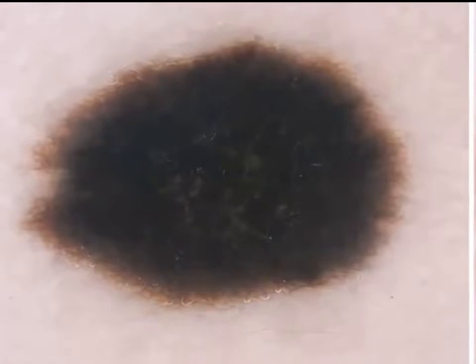Here, for example, we see structureless in combination with other patterns. Here we see a Reed's nevus. We have a structureless pattern in the center that is structureless in black and radial lines at the periphery. Here we see a small congenital nevus. It is structureless in the center, but not black. Now it is hypopigmented, it is structureless skin colored.